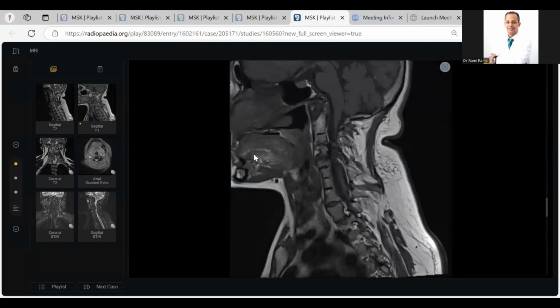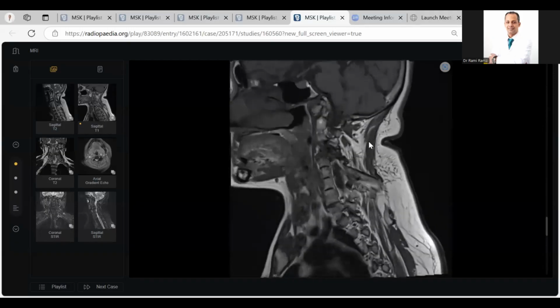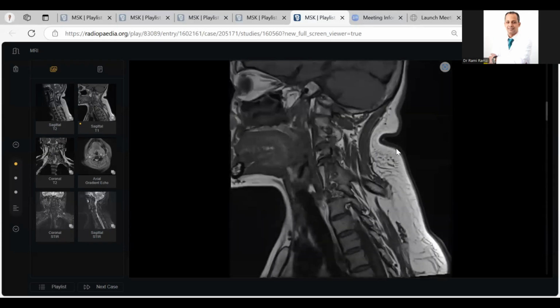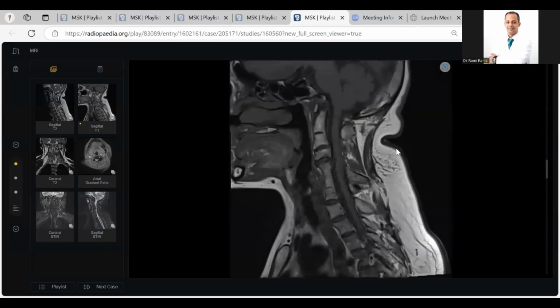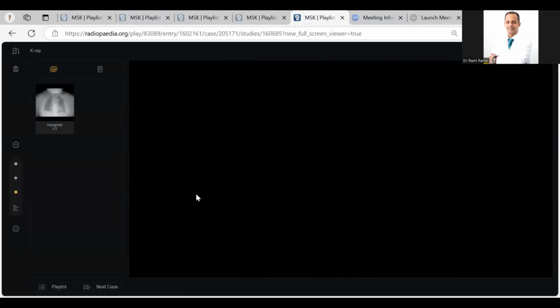Look here, please. Yes, sir. I can't see the cursor moving. Now I can see. So there is a myelopathy, abnormal signals within the cord that could, if this patient has a history of trauma, be post-traumatic. No trauma. This is a chronic condition since childhood. Okay, let me show you an old film.